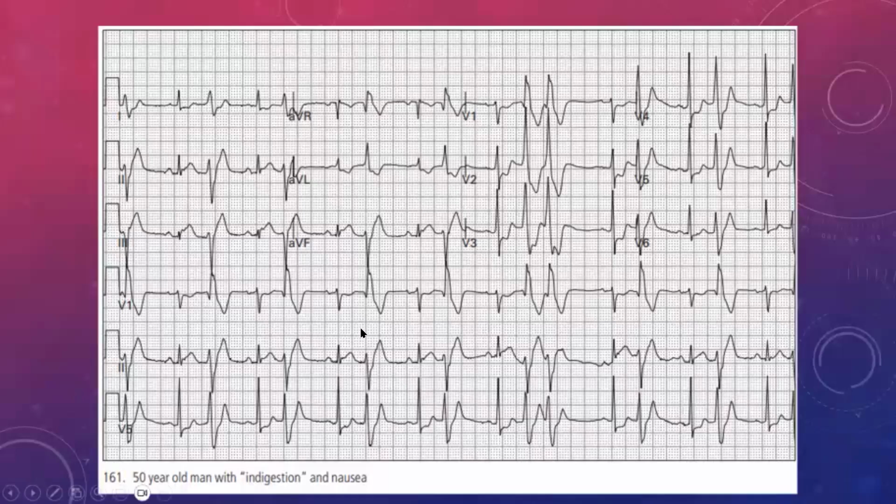So the worst thing that can happen now is that the infarction spreads while we're waiting to do everything. And as the infarction spreads, it tends to affect more of the conduction system and more of the muscle, so we may find that the heart is unable to produce these PVCs or ectopic beats. And then we go into more and more of a bradycardia. Because remember, even though we do have a sinus bradycardia, these ectopic beats are actually helping the patient to stay alive. So should they disappear, you've now got a patient that's going into bradycardia.